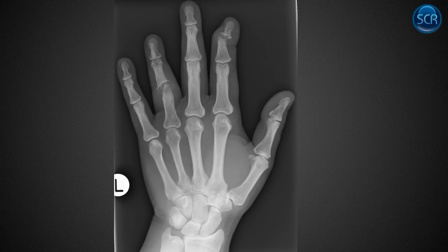What is this case? The wrist looks fine, so we're probably not thinking RA. They do have arthritic changes here, though, which are destructive. Resorption of the articular surface, pencil-and-cup deformity. That's a finding we see with psoriatic arthritis and arthritis mutilans. So it really destroys the joint here, and it's a little bit more haphazard in its distribution than RA, which tends to be a little more bilaterally symmetric, especially in women. They've got a bone island here in their fourth distal phalanx, which is no big deal. That's the case of psoriatic arthritis.